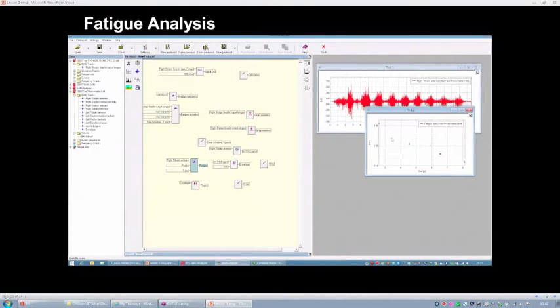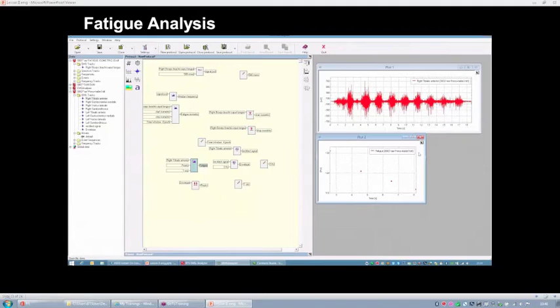As you can see, also in this case, we can see a decrease of the median frequency during the different contractions of the muscle. So this is another example about how to use the frequency analysis of an EMG signal to investigate muscle fatigue. Okay, so I think that we can stop this lesson.